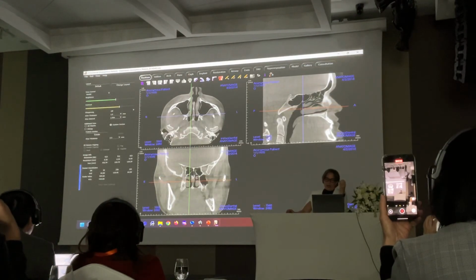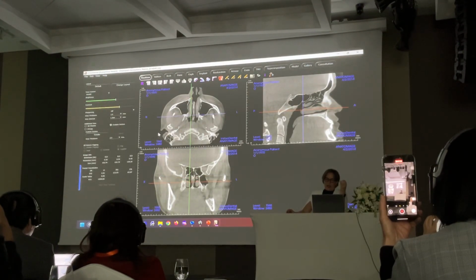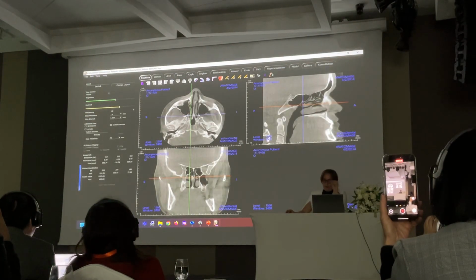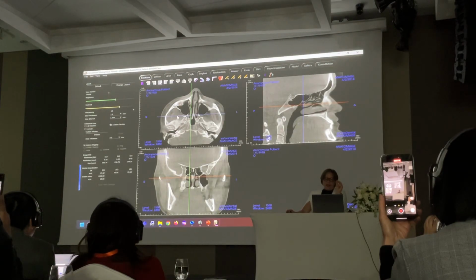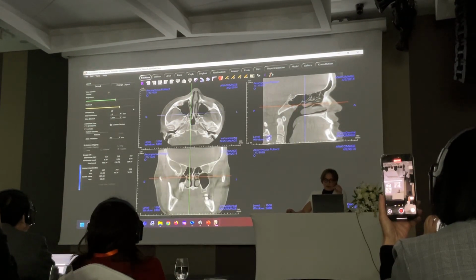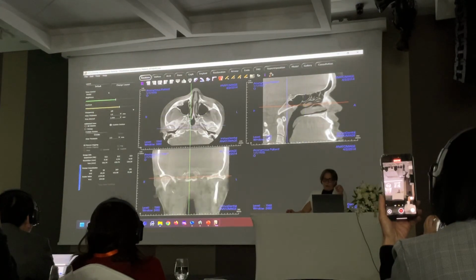You see, this is where the hearing happens. Here's the ear. It goes through here and into this air-filled space. This is the bony part of the external auditory canal. If I take this line right here, which represents the coronal plane, you see how this is moving when I move the blue line?